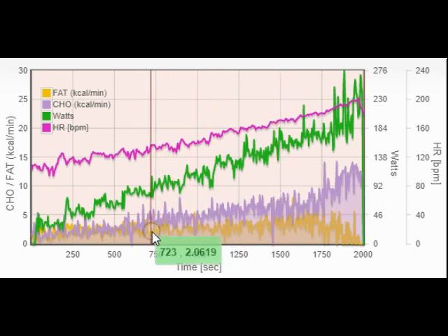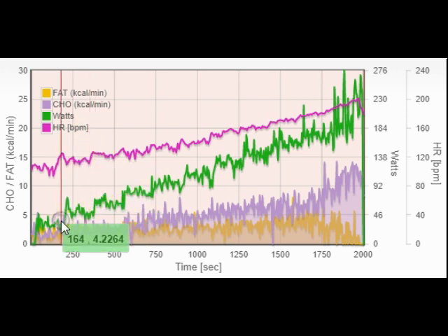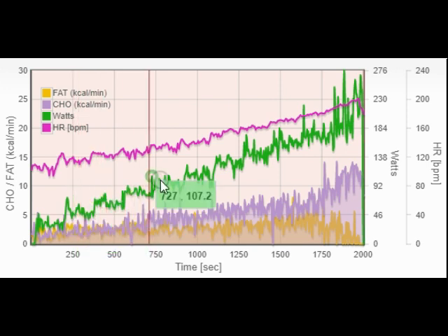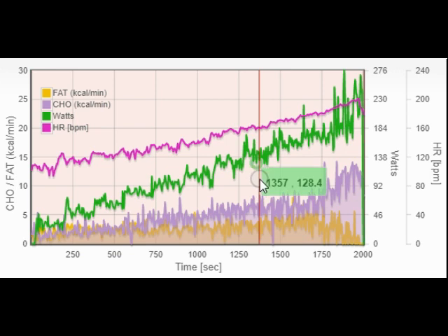This person's crossover occurs right around 60-65% of their max heart rate, which is not good. That means that all this activity, even that low-level activity over here, low wattages, are covered by sugar when they shouldn't be. They should be covered by fat. So a person can have a lot more energy, have a lot less inflammation, a lot less oxidative stress, lower CRP, lower insulin resistance, and just have a much better cardiometabolic health and performance profile.